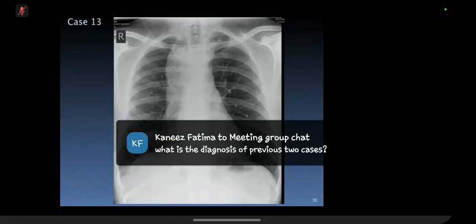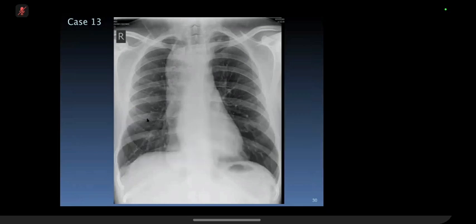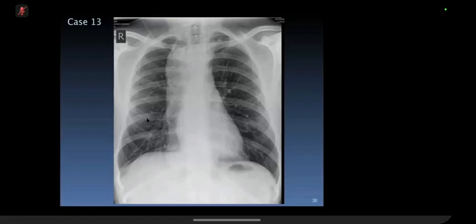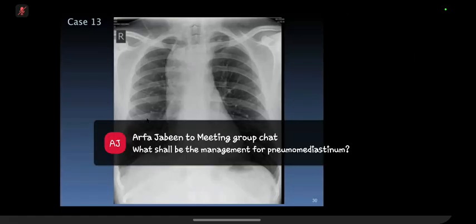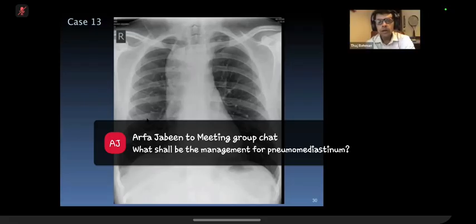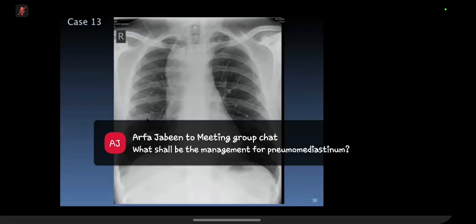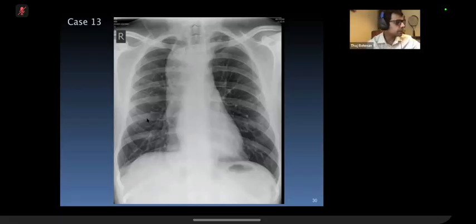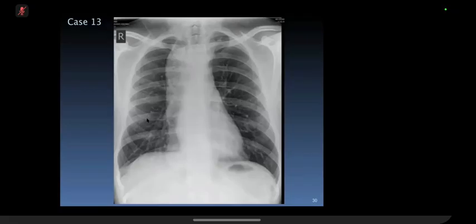And how old do you think the patient is? Any calcification of the costal cartilages? I do not see any calcification of the costal cartilages. Okay, so there's no previous surgery. What about gastric air bubble? Can you see the gastric air bubble? I do actually see the gastric air bubble as well. So I'll just take a step back. I don't think this is post-surgical appearances.